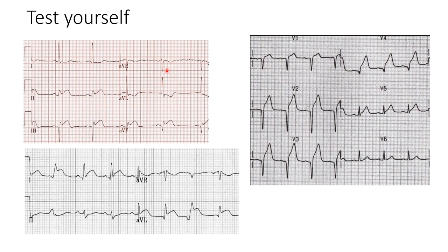And then AVR it's normal, so we ignore it. Nothing in AVL, but we also see a Q wave present in AVF. So what else is present here? We see ST elevations. So we can say that since this is affecting 2, 3, and AVF, it is an inferior myocardial infarction. And you can say it's acute since we see ST elevations along with it as well.